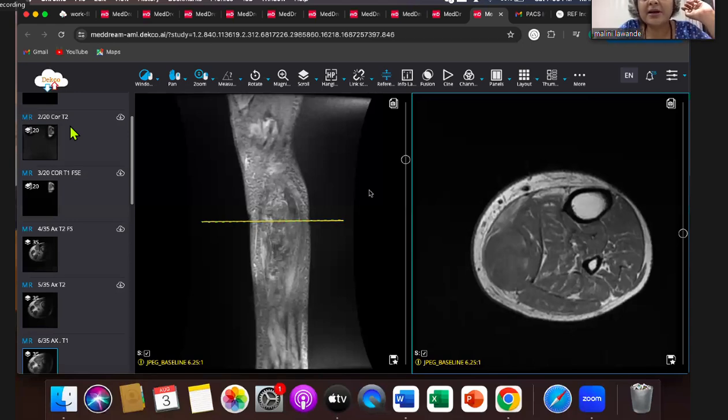The cavernous hemangiomas don't show arterial phase enhancement. Sometimes there can be a few arterial feeder-like things, but mainly the enhancement is in the venous phase. Glomus tumor, like I said, is a very small lesion. T2 bright, T1 isointense, you may not see it. The idea is to pick up that T2 bright area and give contrast also.